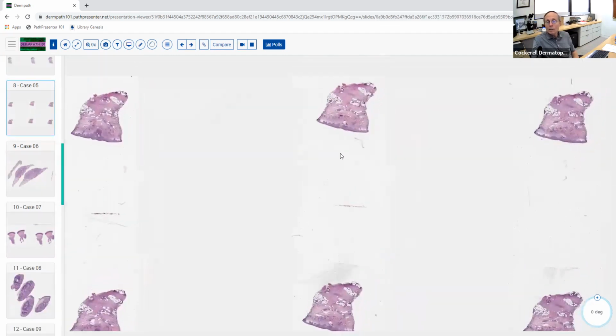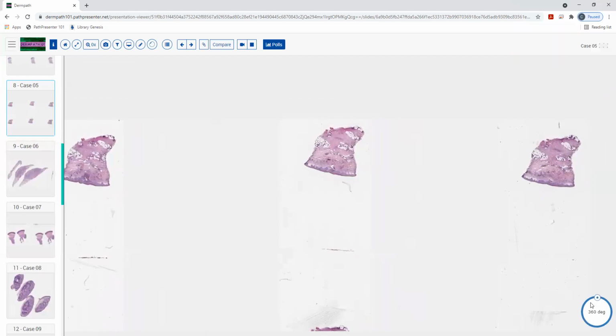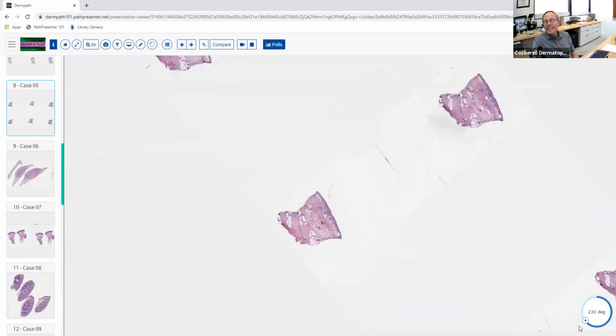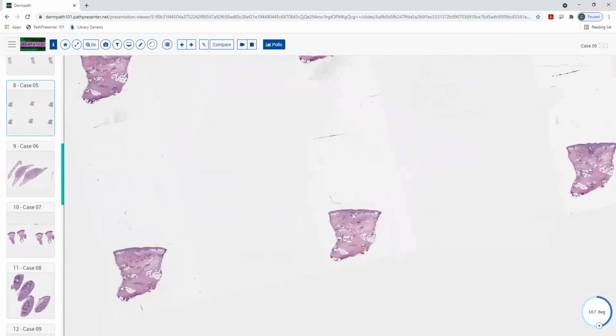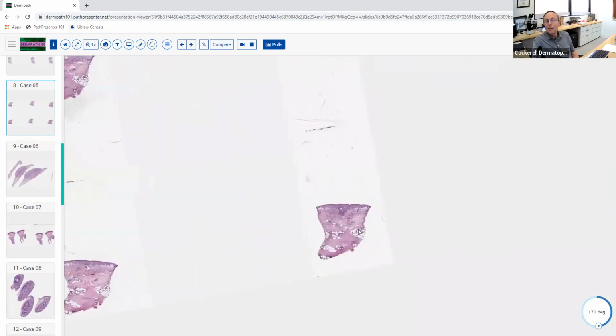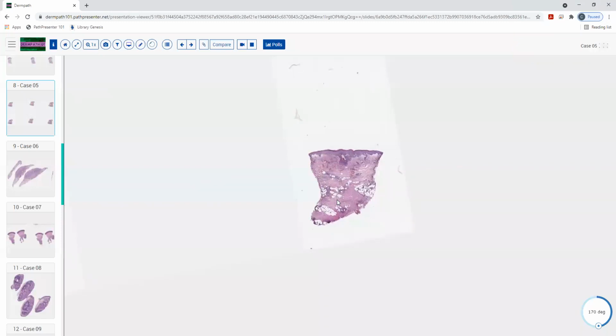Now, one other final question. Do you need a special stain to identify that as mucin? I mean, there are special stains. Yeah, people love to do special stains. It's a good way to make money, but do you really need it? Did you need it there, or could you tell based on what we just saw? Maybe if it's classic, you don't need it. You don't need it.